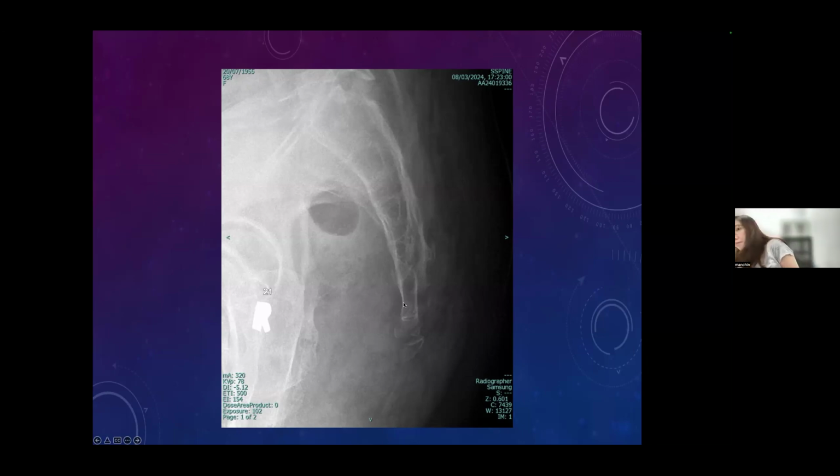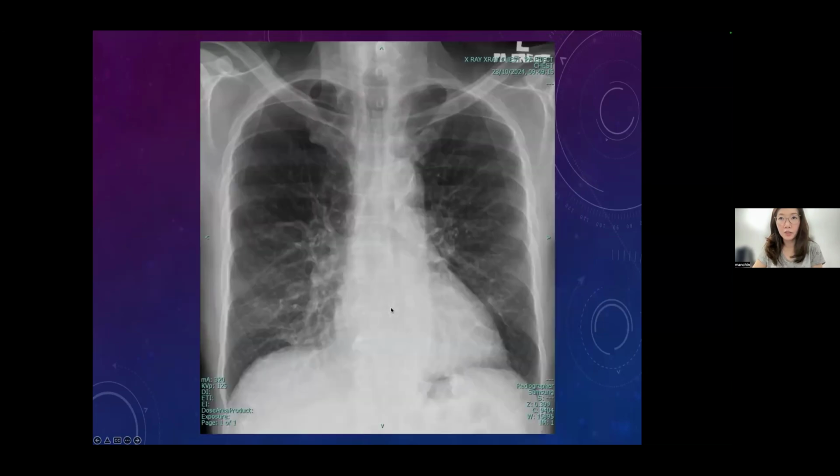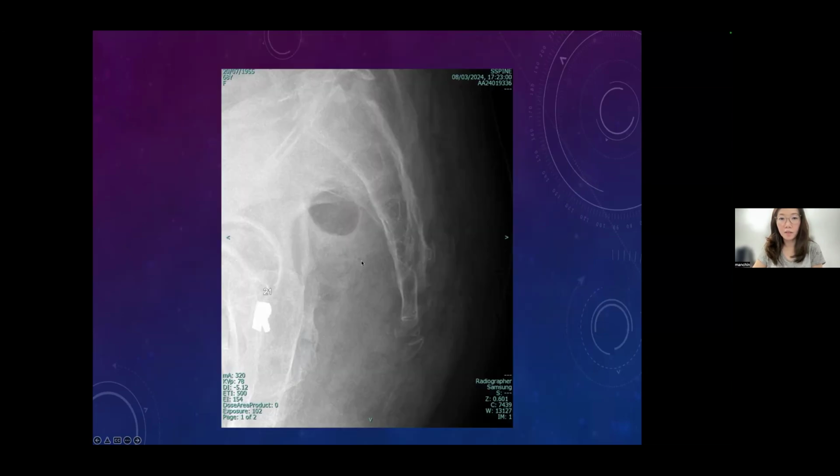So this is the sacrococcygeal region. We must have a smooth alignment. You must always draw the line following the bony outline here. Whenever you reach the coccyx here, there's a fracture. You can see there's a fracture and then it's dislocated, down here, this part.